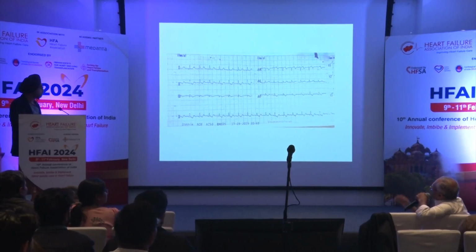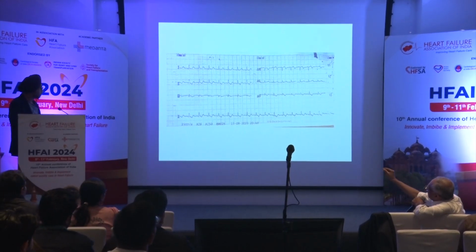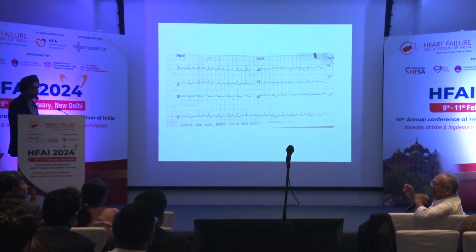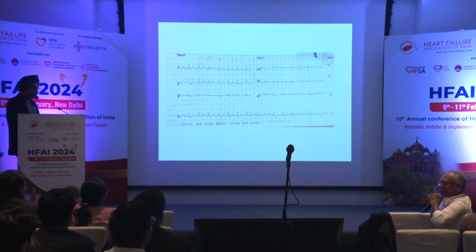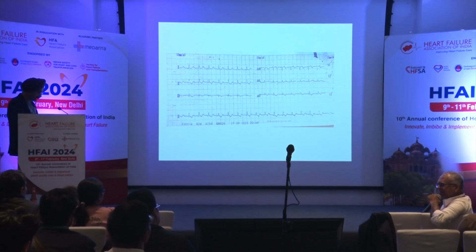And this kind of an incessant tachycardia, the location, look at the width of the P wave. Is it narrower than a sinus beat or broader than a sinus beat? The P wave, and its activation is from inferior caudocranial activation. So that is an inferior structure.